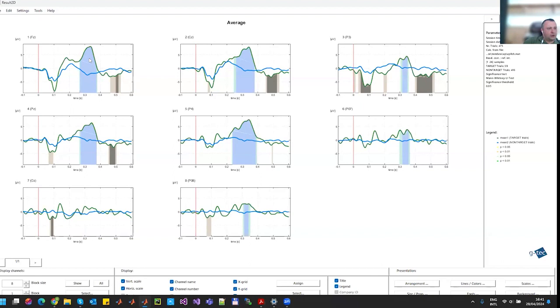By target trials, I mean when the user focused on that stimulus, and non-target trial is when he did not, when some other distractor was played, or, if we are discussing a P300 speller, when he watched the other characters flash.